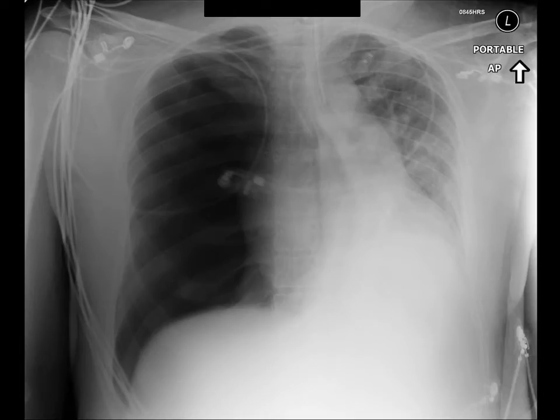What is your diagnosis in this case, and what would you do? A tension pneumothorax develops when air continues to enter the pleural space but cannot exit the pleural cavity. Pressure builds and can obstruct venous return. A tension pneumothorax is called a tension pneumothorax because the mediastinum is under tension and so midline shift of a mediastinum is present.